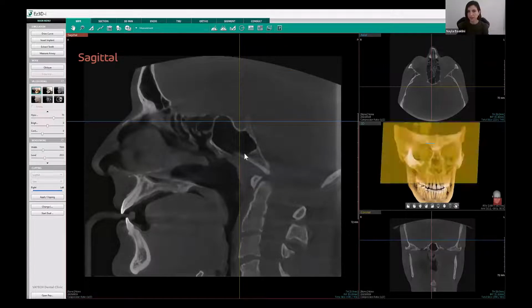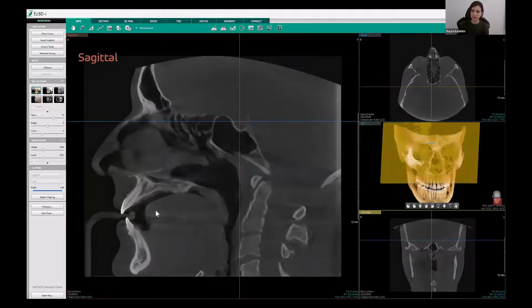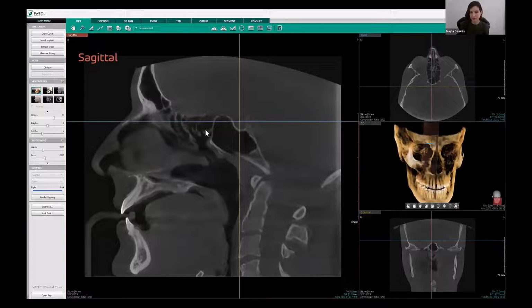Absolutely. And it's a great way to exercise as well. Let's say I know how the sella turcica looks on a sagittal view. Just point it out, look at it from other views, and that way you can exercise and be able to identify it without the crosshairs later on. And that consistent review of the scans is the learning process of being able to identify and build on the information that you already know and then add more information as you go.